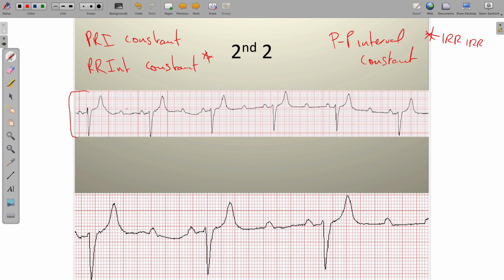So let's go to the ones that are obvious first. So there's a P wave here, and a P wave here, and a P wave here, here. I think each and every single one of you probably recognized the location of these P waves. Now, I started by saying you don't need to look at the P to P interval because it's always constant. That's a given. What you do need to keep in the back of your mind is that the P to P interval is constant, and therefore when you see grouped P to P intervals like this, you'll see that the P to P interval right here is this long, and here it's this long, and here it's this long. So how many P waves are in between each QRS complex? And the answer is 3.